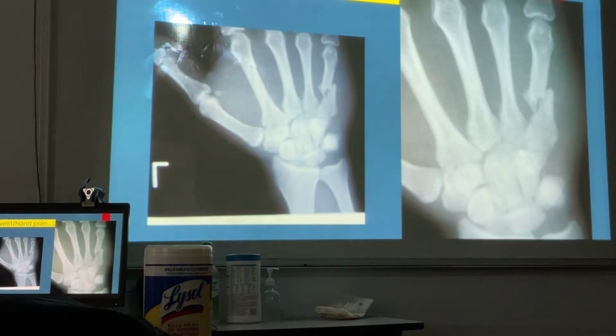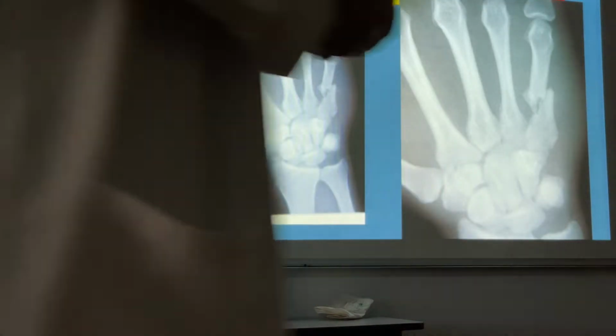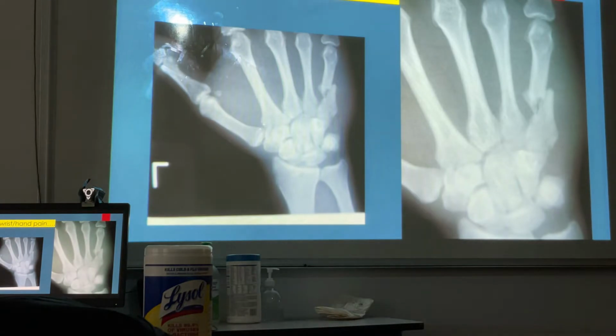Why am I here? Okay, we did this, and we said, what was the importance of this? The hand x-ray. The scaphoid. Scaphoid, okay, fair enough for wrist, but when it's this, that's not normal anatomic alignment compared to this. Correct. You don't have to look, you can go to Orthobullets and search fractures to find out what kind of fracture that comes in semester 8.